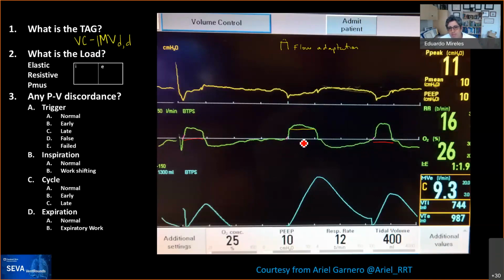The patient will get as much, but now this is a patient-triggered and patient-cycled breath. And so it becomes a spontaneous breath suddenly. So this is a beautiful example of a mode in which you set it as volume control, but because there was a secret button that you pressed, it turns it into VC-IMV. And that perhaps is totally okay. We don't have anything against that, but you need to know that that's what's happening.